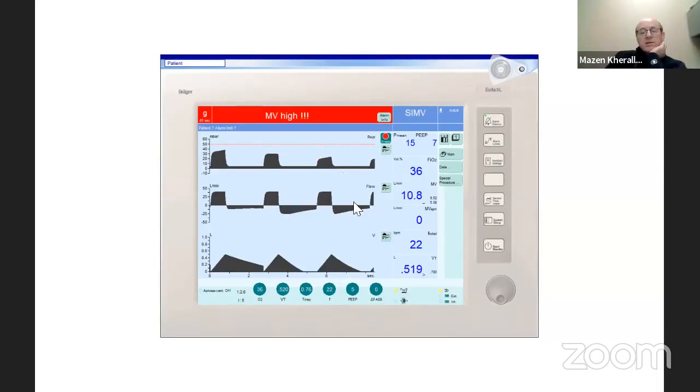Look at this one and this one here. You can see in flow limitation, the peak expiratory flow is decreased. That's number one. And number two, the slope of expiratory flow is shallower compared to the slope here. You can empty faster here. Okay. And number three, you have persistent flow.